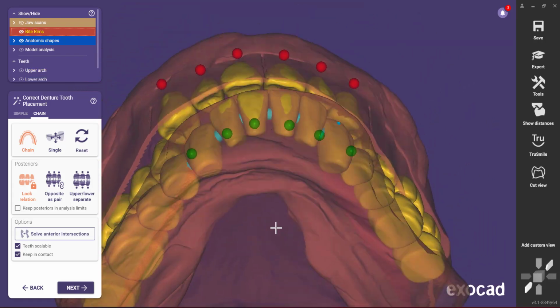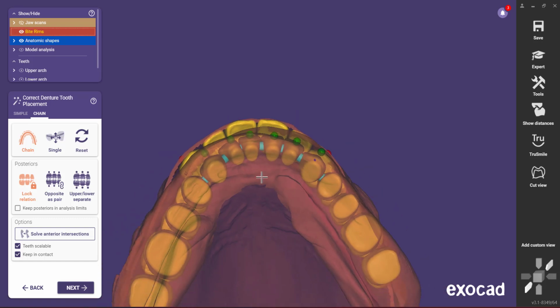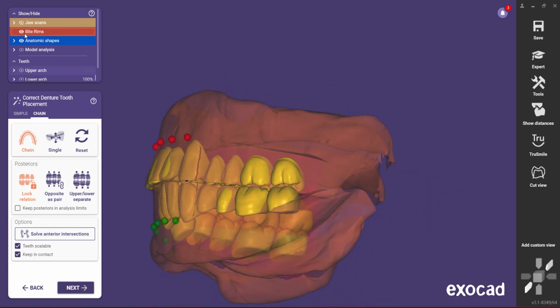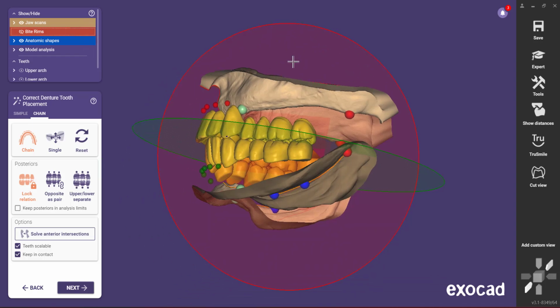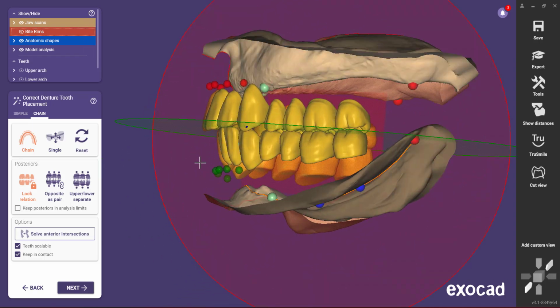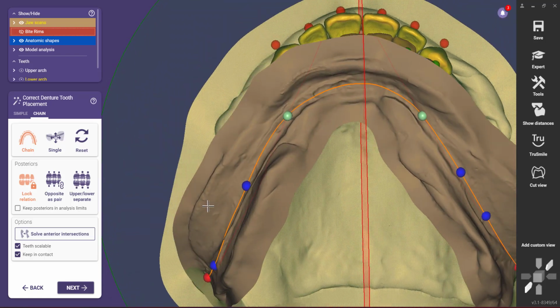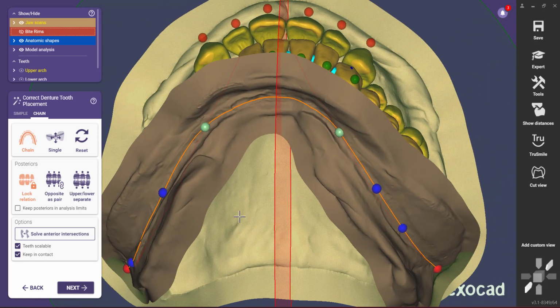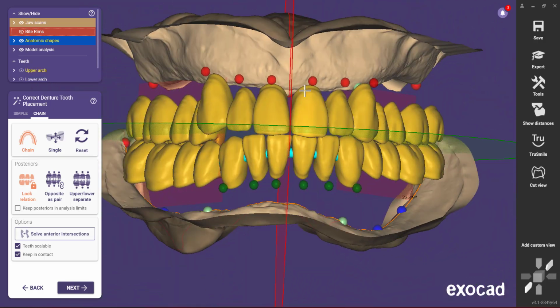And now I'm going to set my mandibular anteriors to that. And so here's one of the keys with dentures. If you get these mandibular teeth too far off of the top of the ridge, man, you're going to have a lot of trouble with denture stability. And so this is where you might end up sacrificing a little bit of your aesthetics to tuck the teeth back more, or you might end up having more of an anterior open bite.